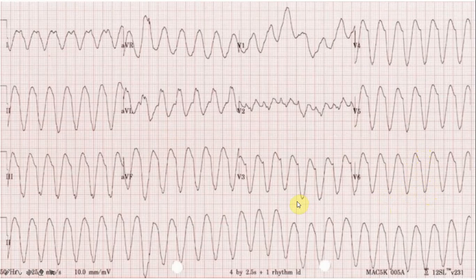So if the RS wave is absent, we can confidently say that this is highly likely to be VT, and we know that from Brugada criteria specificity is 100%. However, the sensitivity is not that great, 21%. So this particular pattern you might not see that often, it's not that common. So if you cannot see this particular type of ECG, then you need to go to the next step, which is the Brugada sign.